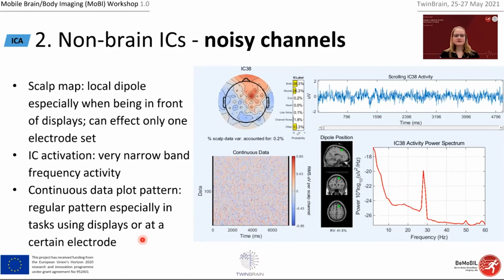So this is also interesting for the Zapline approach, that this was not well covered, even though we tried. If you have the data sets, you can fiddle around a little bit and find out how to remove this noisy component that may be due to some setup component in this data set.